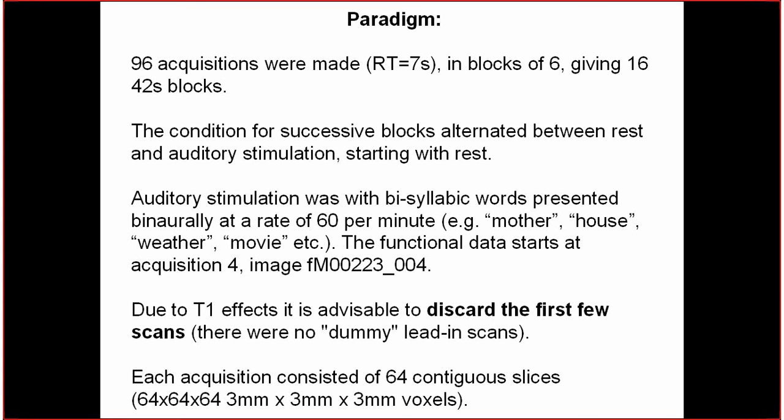It was a block design, which means that every 6 scans were acquired during the same condition, either stimulation or the rest. That gives you 16 blocks. Each block lasts 42 seconds. The blocks alternated between the rest and auditory stimulation, starting with rest. This was the first block.